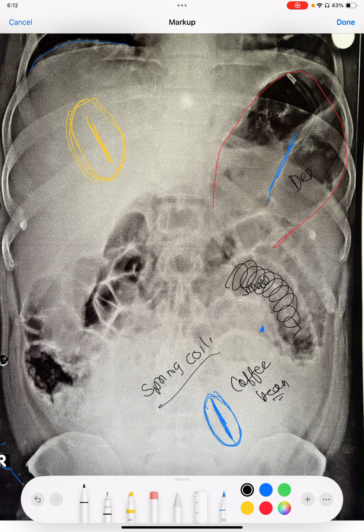This patient went for exploratory laparotomy. The volvulus was reversed, and the contents which were getting obstructed in the intestine were manually removed by squeezing. After that, the patient got completely better and was discharged.